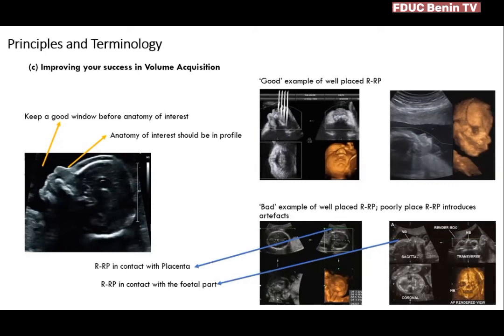However, there is the fourth or the fifth component or element, which is the reference reconstruction plane. This appears to be the line of sight, right? How is the operator going to see this anatomy? So if you pick your palm, for instance, and you are looking face first to your palm, the immediate surface of your palm is what the machine renders in a surface rendered mode, right? So the reference reconstruction plane serves as the observer's eye.